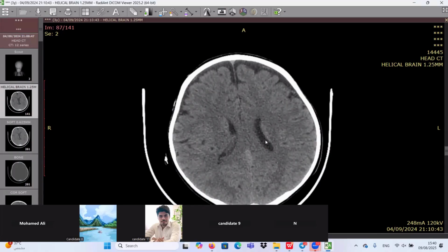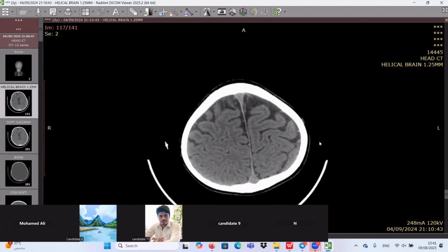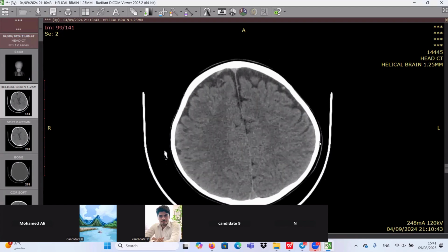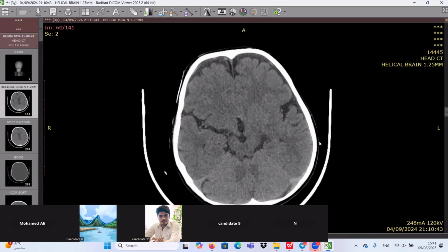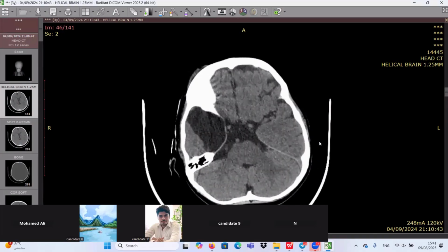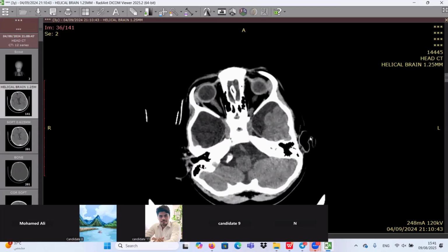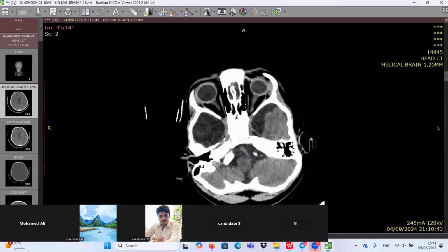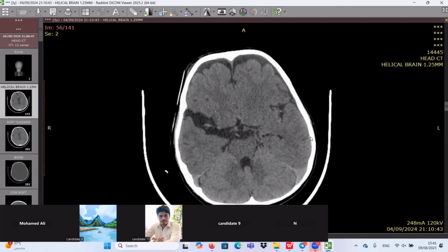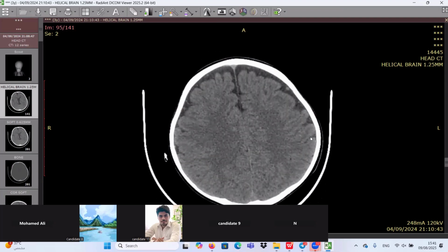Okay, so I have been provided with a non-contrast CT brain of a child, I guess. There is no acute intracranial hemorrhage. There's no mass effect or midline shift. I can see on the first row that there is a prominent extra-axial CSF space along the right anterior temporal lobe, which looks to be an arachnoid cyst given its location. The rest of the brainstem and cerebellar hemispheres appear normal. The rest of the temporal lobes and the rest of the brain appear normal. I would ask for the history and age of the patient, please.